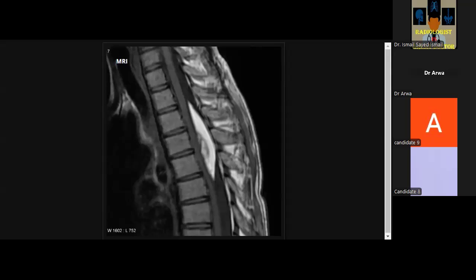I would like to review the clinical data of this patient if there is any history of anticoagulation or trauma. However, I cannot see any vertebral compression fractures in this patient. I would like to see for the history of any coagulopathy. I would urgently pick up my phone and inform the neurosurgical department about this bleed and cord compression for decompression in this patient. What if I told you the patient has insidious chronic symptoms, no acute symptoms?